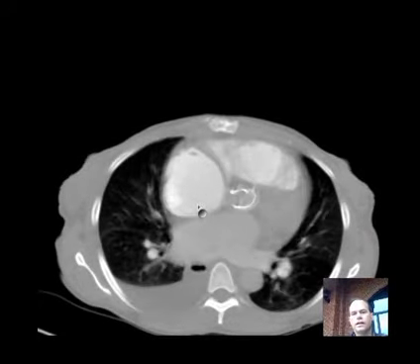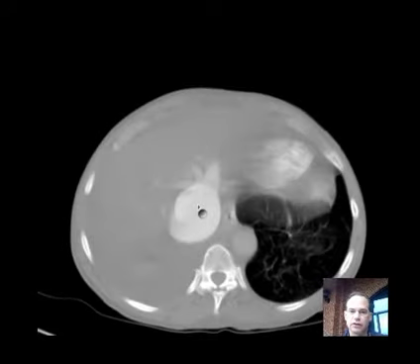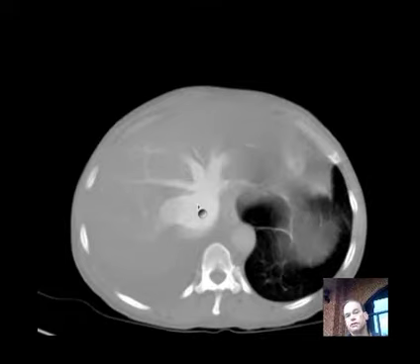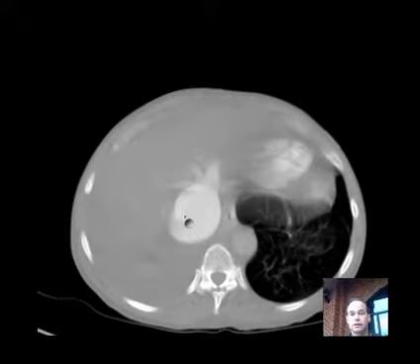So here we're beginning to see the dynamics of the anatomy. We're beginning to appreciate the dynamics of the vascular system, heart failure. This is right heart failure. Left heart failure, of course, looks different. You see the anatomy of the inferior vena cava. And so now if you see an ultrasound or a CT abdomen and someone has got these very dilated hepatic veins, you know you might want to think about right heart failure.